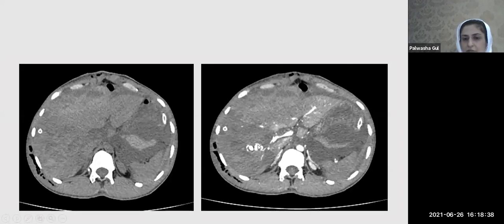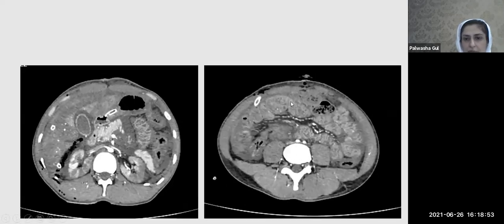What was interesting in this patient was that this was actually a contrast extravasation, but it was from the replaced right hepatic artery. So there was an anatomical variant as well. Then there were hyper-enhancing adrenals, and there was hyper-enhancement of the bowel wall and kidneys. We were looking at the kidneys, thinking if this is a laceration or a contusion. It was actually giving us a striated appearance, and then we thought of tubular necrosis, okay, because the patient was in shock.